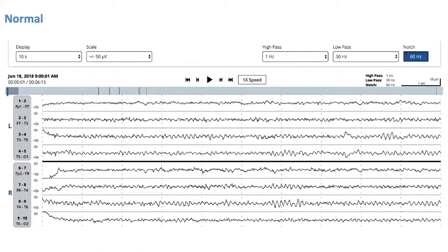Would you comment on this waveform in the back of the head, usually around here and here, or in this channel? Yeah. Between 8 and 12 of these waveforms per unit of time. So this is the posterior dominant rhythm, also called the alpha rhythm. It's called the alpha rhythm because it was the first rhythm to be discovered in the early days of EEG, the 1920s.